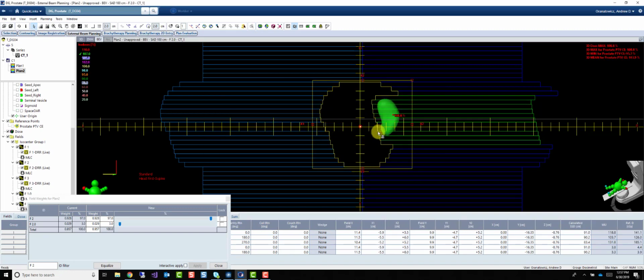Again, when we drew this block, it was right against the edge of this 107 volume, and so every time we do this, we're shrinking that volume. So I like to start with 3%, but you can certainly play with this number. Let's type 5%, see what happens. You can see it got even smaller. 1% stays about the same. So it's all depending on your preference and what you're trying to do, but to start out with, while you're learning how to manipulate the treatment planning system, I think 3% is a good number.